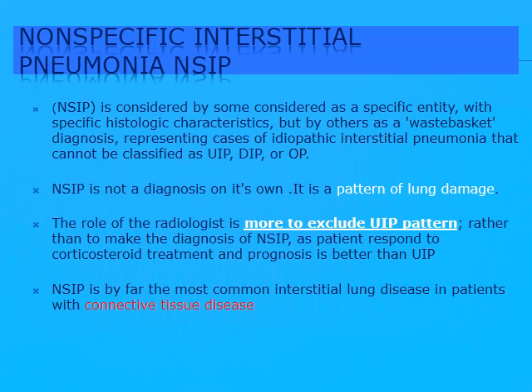NSIP is not a diagnosis by itself, as I have told, it is a pattern of lung damage. The role of the radiologist is to tell the clinician that it is UIP or not UIP pattern. And I will show you at the end of this part of the presentation how we can report these cases and tell, is it definite UIP, possible UIP pattern, or not consistent with UIP pattern. This is our role.